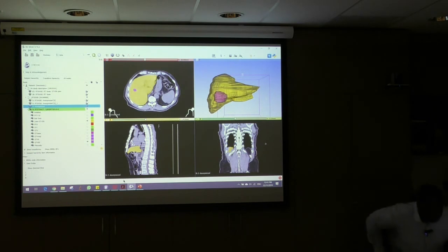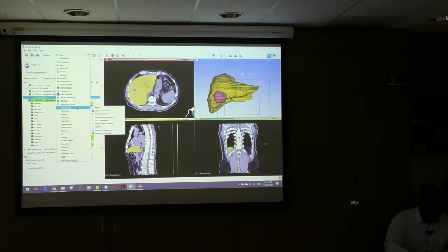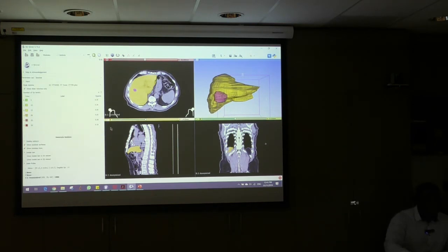Okay. So this is a proton and carbon ion case that I already loaded up earlier. I have gone through and deselected the structures that I'm not interested in. So for the isodose module, you just go into the radiotherapy and then you can select it, and the workflow for this particular module is quite intuitive and straightforward.